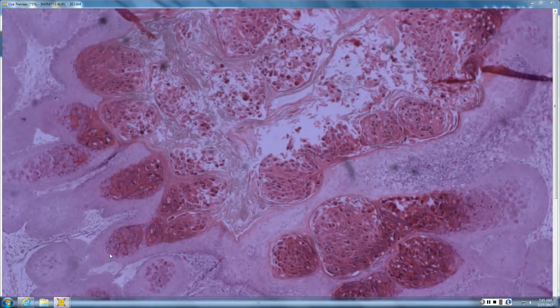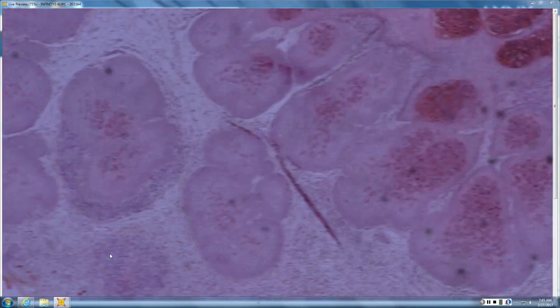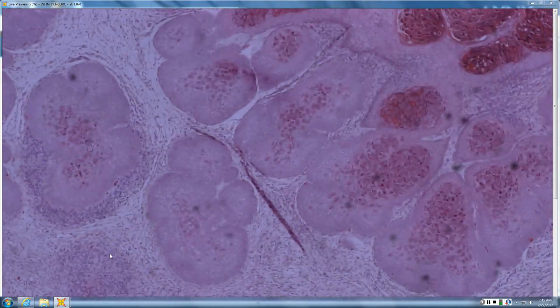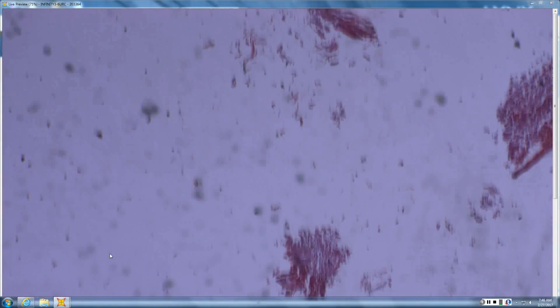So I think it's me. These look like molluscum bodies. Henderson-Patterson bodies. Exactly. So this one, very straightforward, makes a good coffee table picture. Probably never appear on an exam because it's far too easy, right? And that doesn't count as your turn.